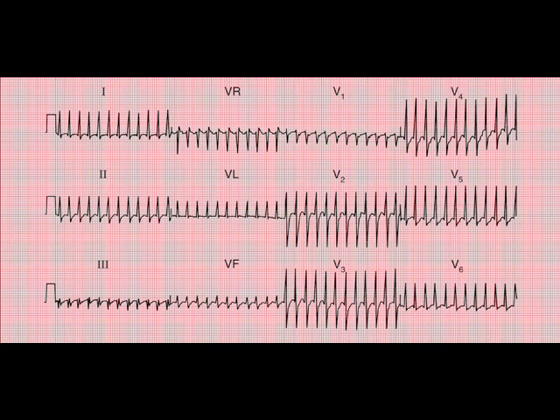So we call it a narrow complex tachycardia, but it's highly likely that the impulse driving the heart is in the atria. It is unlikely to be sinus rhythm, even if we slowed it down, because if somebody is in front of you, in the bed, in the chair, on the couch and so forth, resting, and they have a heart rate this high, it's very unlikely it would be sinus rhythm, very unlikely indeed.